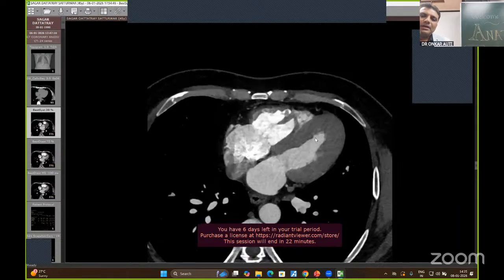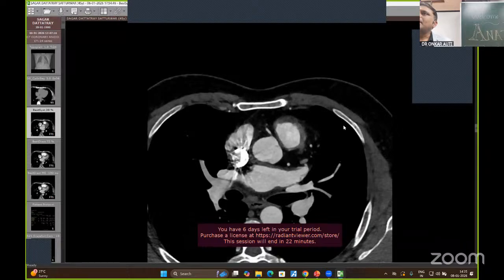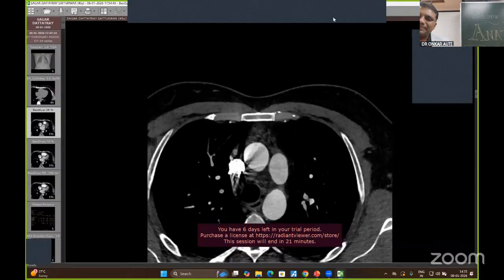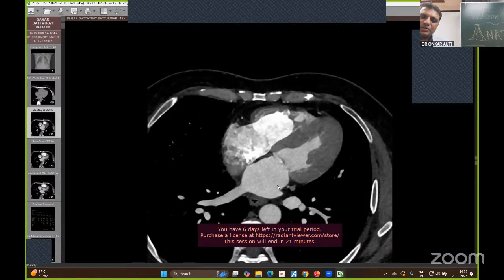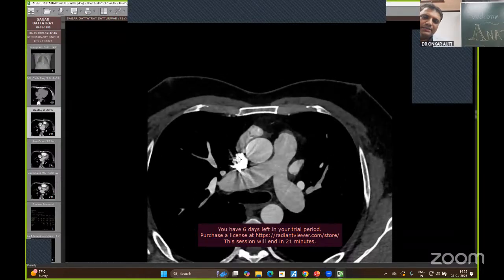Okay. So from the right ventricle, the blood goes into the pulmonary artery. This is your main pulmonary artery over here. And this is the right pulmonary artery, the left pulmonary artery, and then blood is given to the pulmonary circulation. Then again, the heart receives the blood through the pulmonary veins. These are the pulmonary veins over here. On the left side, 1 and 2. On the right side, 1, 2, and 3.